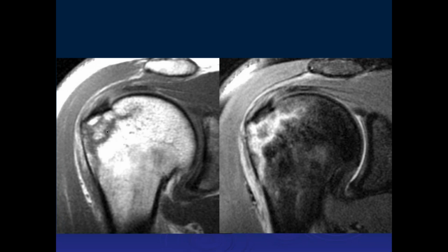So you can have rotator cuff tears, but the other thing, especially in younger individuals, is that you can have the same symptoms as a rotator cuff tear, but it's because you have an avulsion injury of the greater tuberosity. And these are fairly common in trauma to teenagers and young adults. I think this might have been my son who had a bad fall skiing, and I think this was due to a skiing accident.